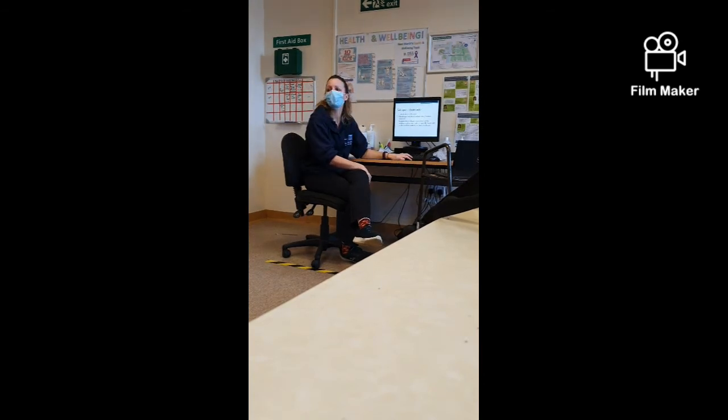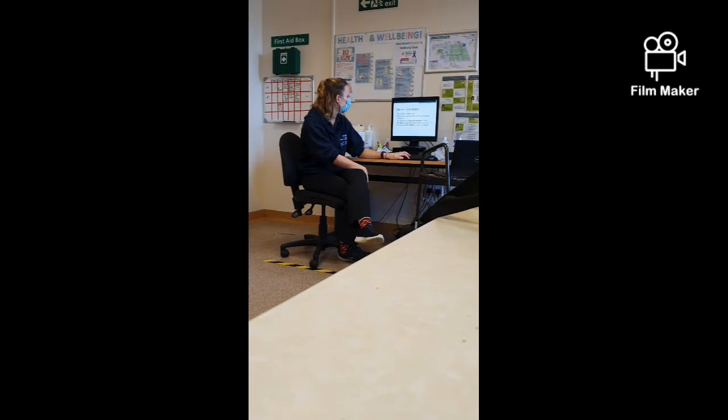Right, okay. So if it is just one lobe collapse, you would still get air in the other lobes, and that would show up on the x-ray. And you just see the white within that portion that's collapsed, but you'd still see some deviation. You would, right. What does everyone think about this one?